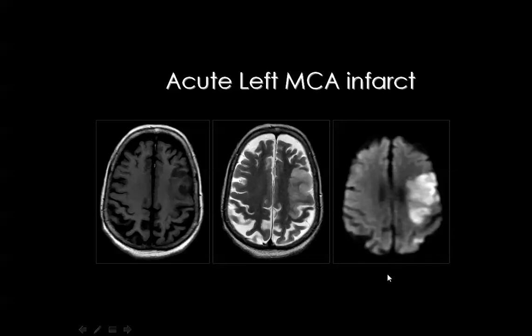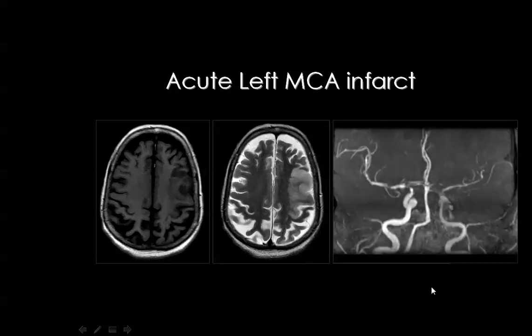And we'll discuss this in detail after that, but for the current time, you should know that the acute infarction will show restricted diffusion in the diffusion weighted MR images, meaning that whenever the CSF is black, the infarcted area will appear bright, and this means restriction of the diffusion in this particular area. And you can easily appreciate the good delineation of the infarcted area by the diffusion weighted images compared to the T1 and the T2 weighted images.